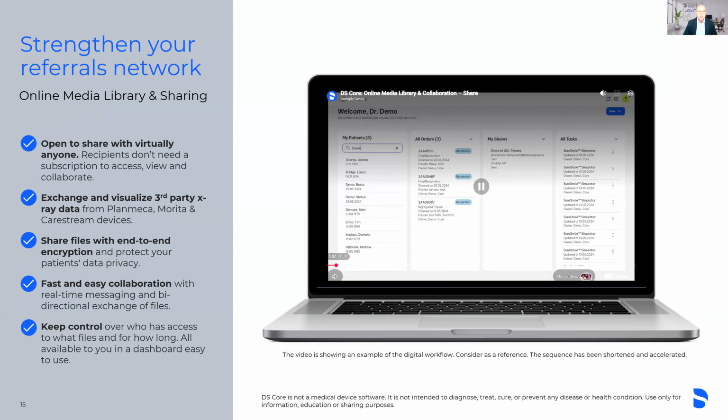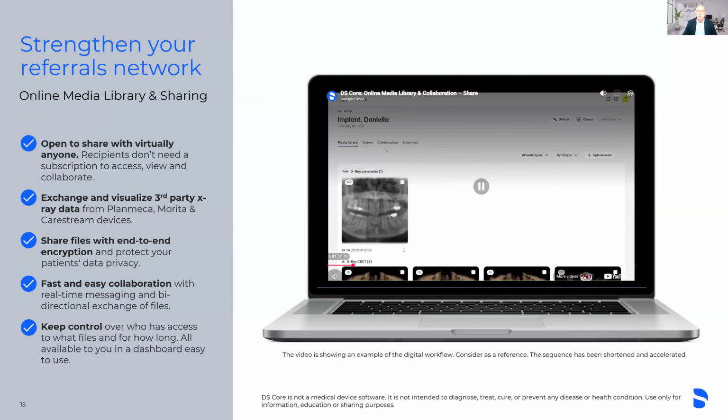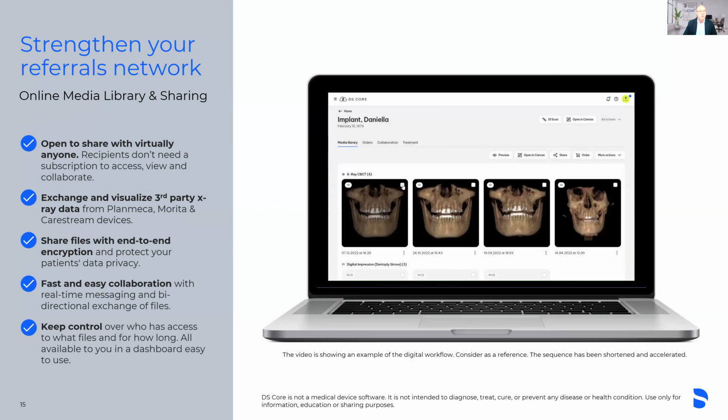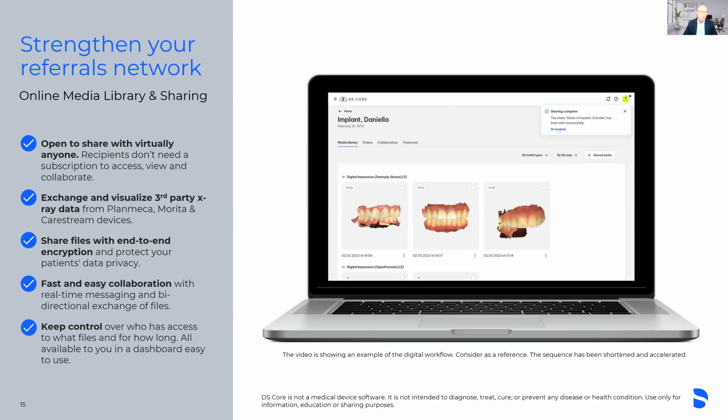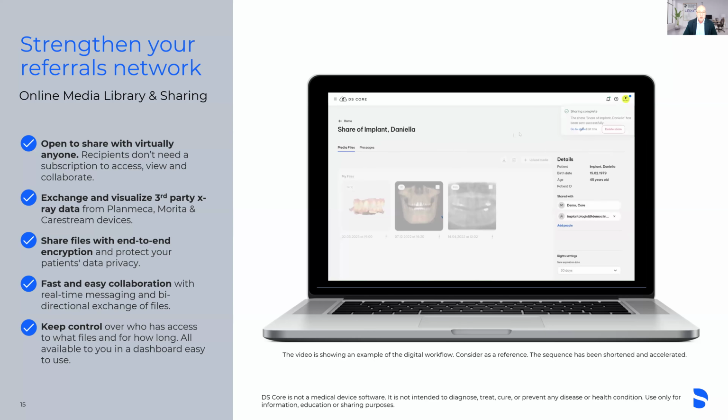And then when it comes to your referrals, now that we have everything in one software system, we have online media and sharing capabilities. For your referrals, you can type in their email address, choose the files you want to send them, and exactly what you'd like them to do with those files. And then you get to set the expiration for those. So you could set it anywhere from a week all the way up to 6 months and share that file.